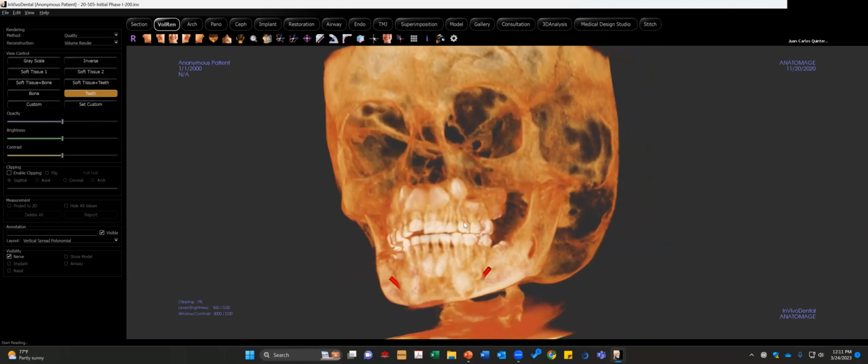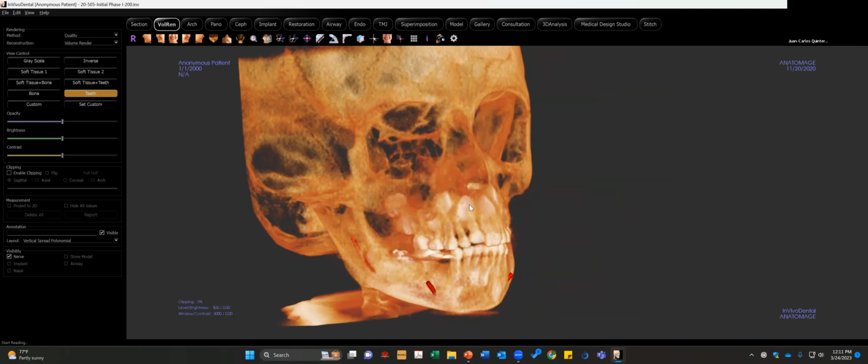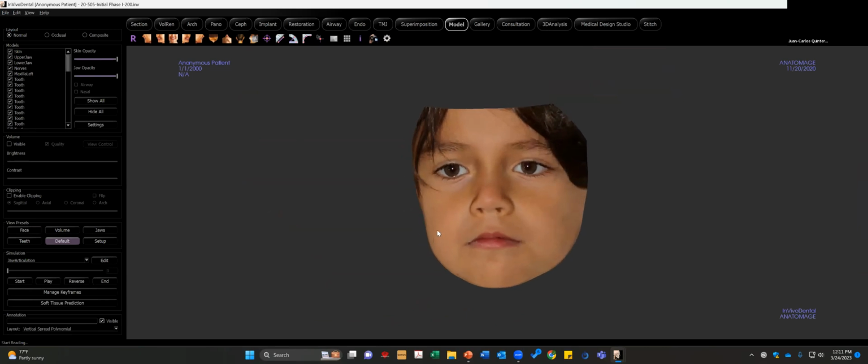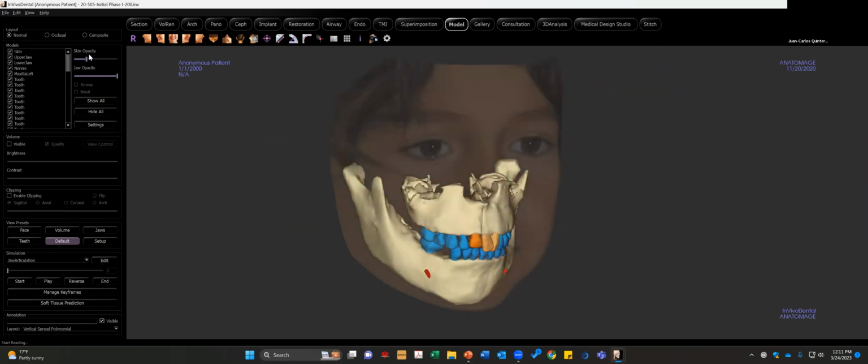What the Invivo model product does is take this data set and perform a process called segmentation and surface mapping of all the elements, including the bone, the teeth, the hard tissues, the nerves, and you get a product known as the Invivo model. This is our all-inclusive single diagnostic file in our practice. Just one file. We virtualize the patient, and everything is layered.